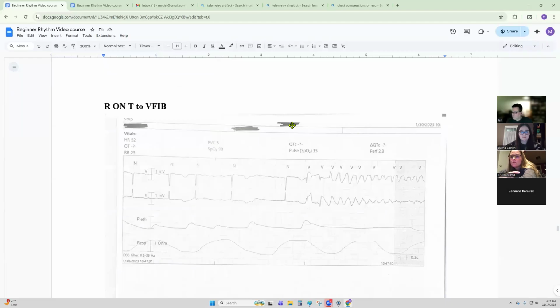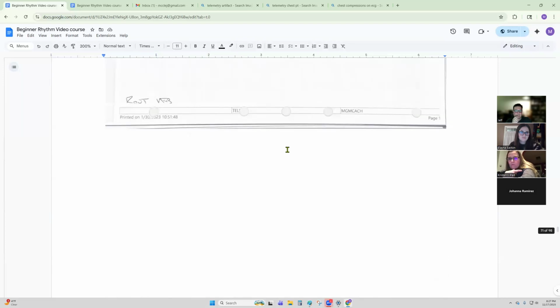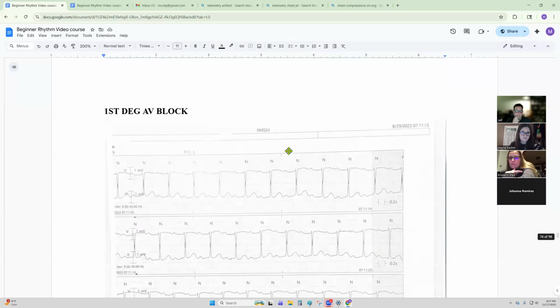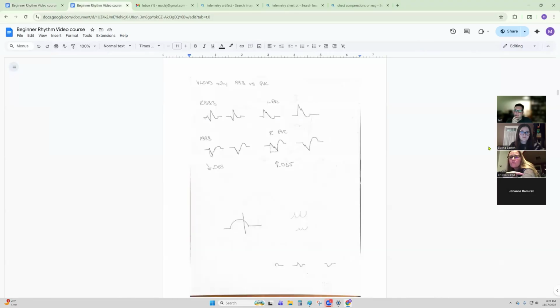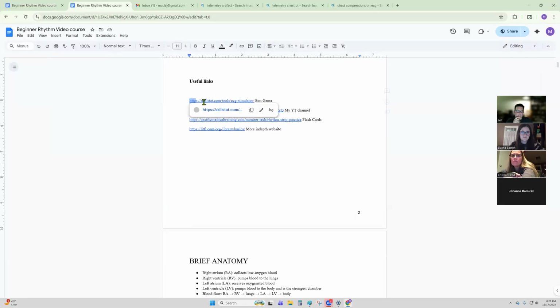Okay. That's a bad one right there. Yeah, torsion. It's just another form of VTAC. Now, let's go to... actually I can just do this the hard way. Get out of there.